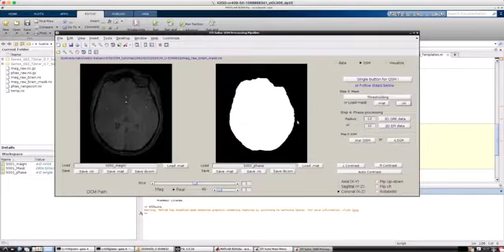And yeah, you can see here that the mask has loaded, and then you can pass on to step 4, and this is related to processing your phase. So now it's actually doing some steps that will create your QSM map. Because we acquire data in 3D with 3D GRE scans, you click on 3D GRE data. In case it's otherwise, I will tell you why. In terms of the radius, I just use the default for now, but you can play around with these parameters a bit and see what it will influence on your data. So I'll just use this and I'll click here.